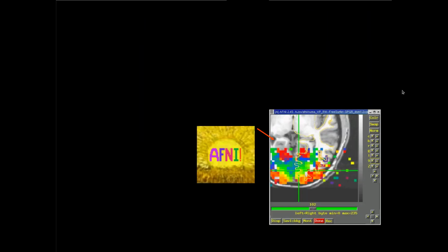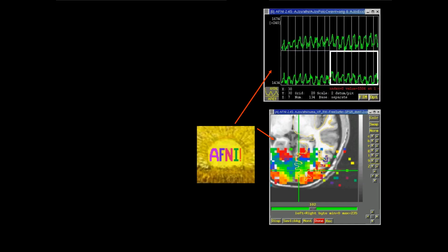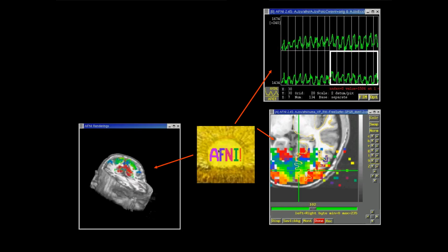Okay, so everything that we've looked at earlier on, if you've been following most of the other videos in this academy, has been looking at data in the AFNI GUI, and we think of the brain as being looked at slice by slice, and our individual unit here is voxels. These are our three spatial dimensions of slices in each of the major viewing planes, and then we can also have another axis of time. However, the brain isn't organized slice-wise like loaves of bread.